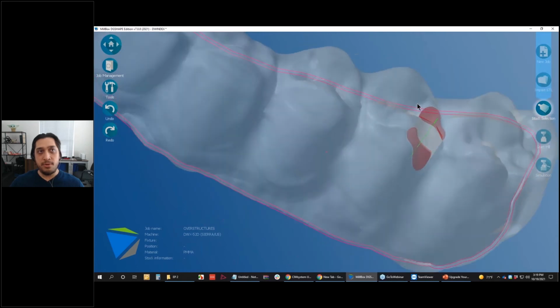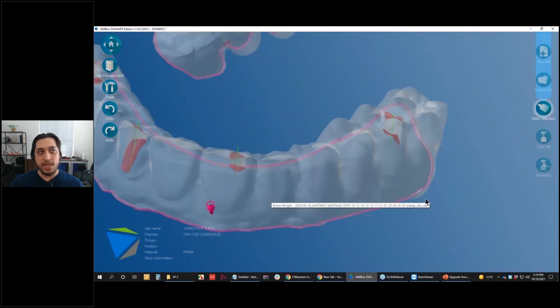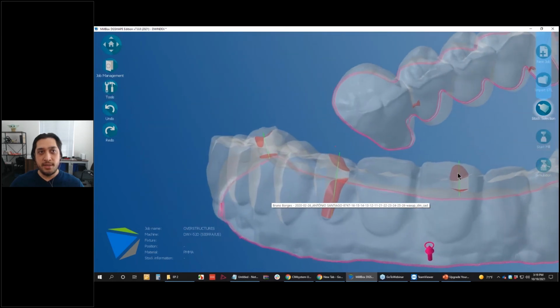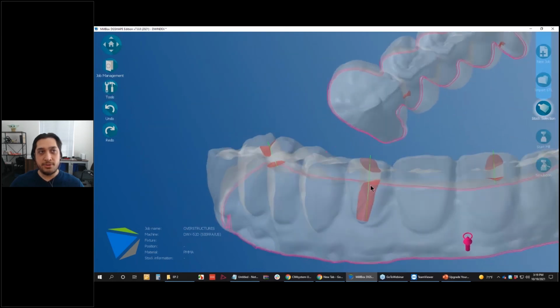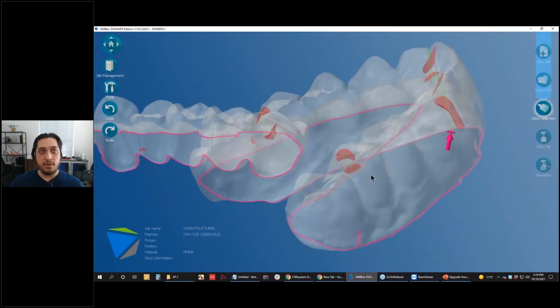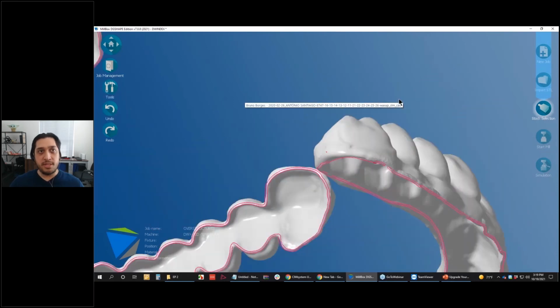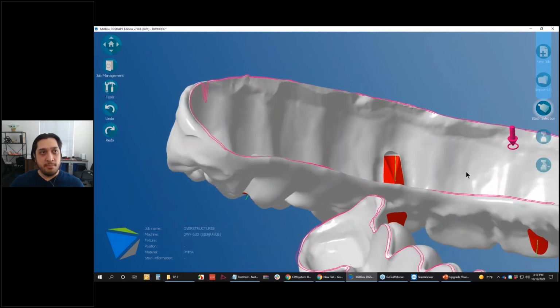And then the second rule was to make sure that the red caps are in place at the top and the bottom of the screw channel. So again, we see the red cap top and bottom, and that drilling axis goes from top all the way down. Same thing as we go across and look at all of these other holes. And so we can look at the bottom side as well.